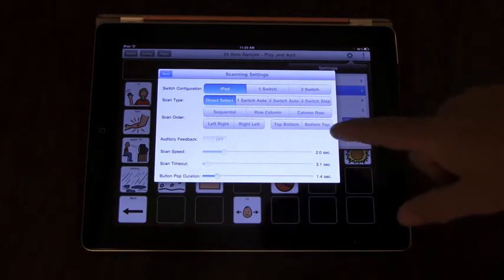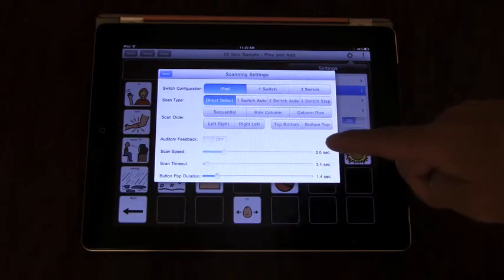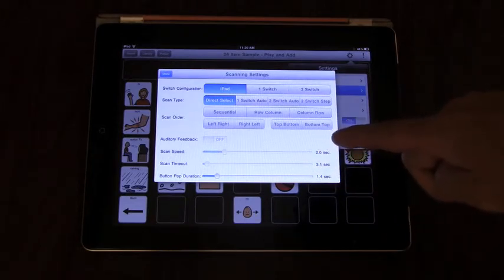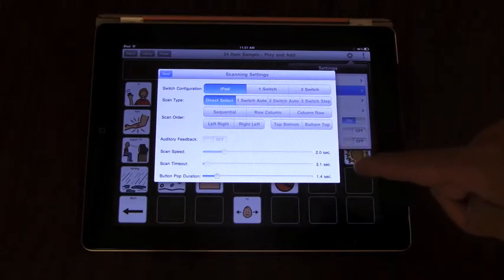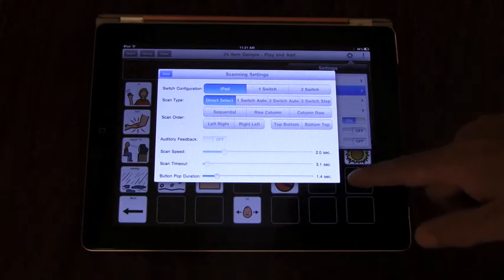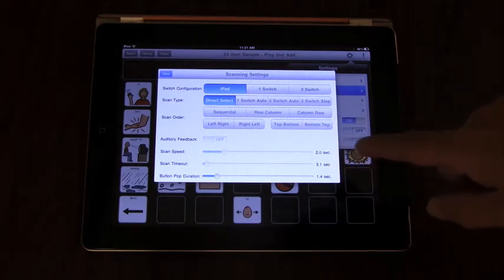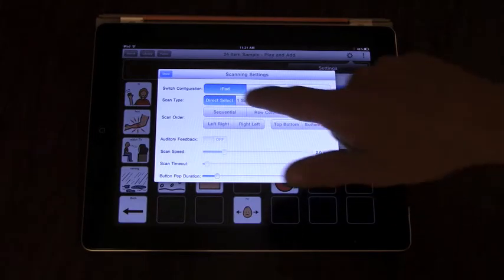TapSpeak Choice will support using the iPad as a switch, and it'll also support Bluetooth external switches. It supports RJ Cooper's and AbleNet's Bluetooth switch interfaces currently. There's no special setup you need to do in the app to start using the Bluetooth switches.